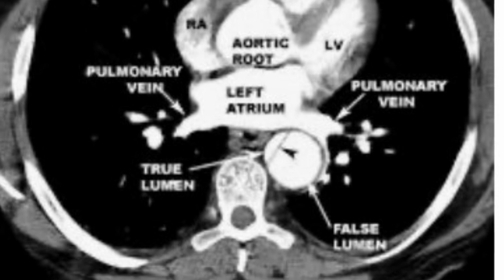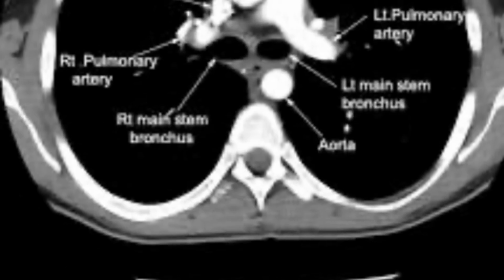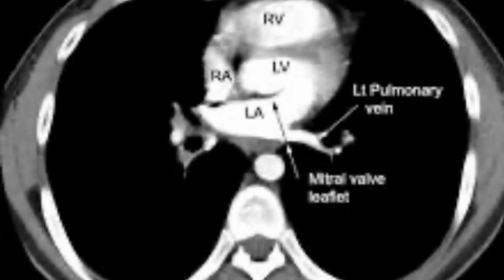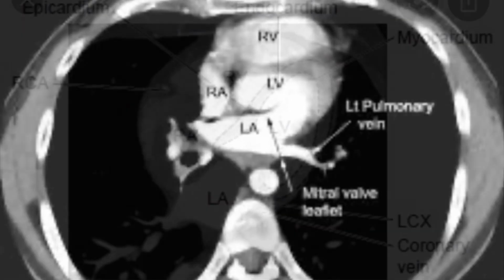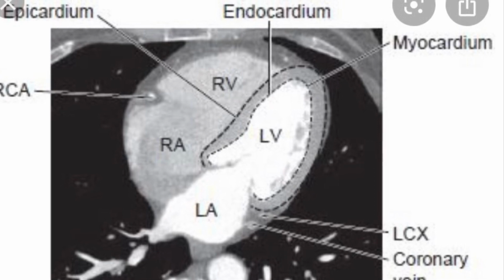Now I have included some labeled CT scans here. You can take their screenshots and keep them as your reference for comparison. And we will be sending you some worksheets to label also. So these are the labeled slides now for you. Hope you have understood nicely.